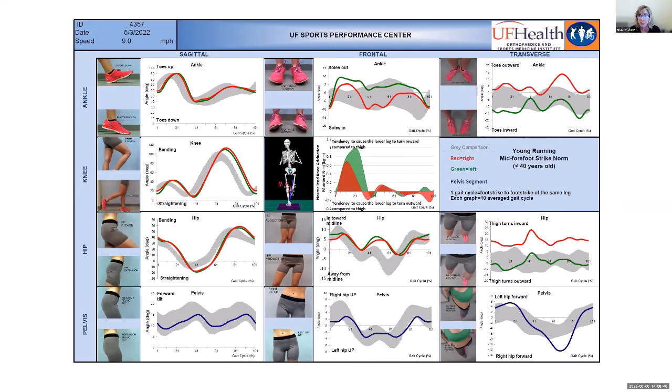Sure. So the last page that we see on here, otherwise we'd end up with a 25-page report for those who love the data. But really what I tried to create here was a panel or a screenshot, an overview of all the motion that your ankles, knees, hips, and pelvis are doing during a typical gait cycle. The one part that I would probably revise at this point is getting the trunk and the arms on here, because the trunk and the arms can drive some of the motion that we're seeing on this page. So just know that those changes are probably coming in the near future.